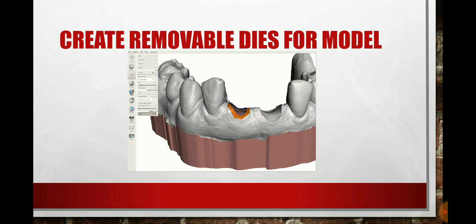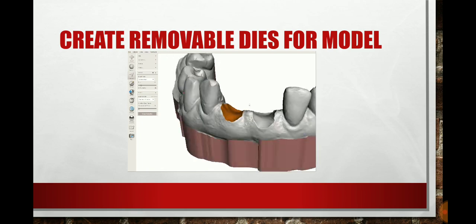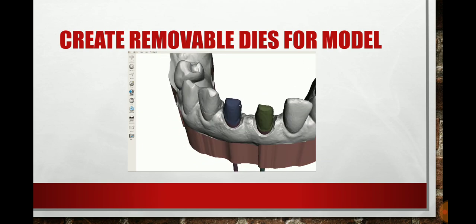So you look at it from different angles. It's always good to change the angles of whatever you're working on. You're working on different planes, so rotate that model around those planes. Okay, and then you can go back in. You can smooth it out more. You can select it. And so in here we put the teeth back in, and put the preps back in.